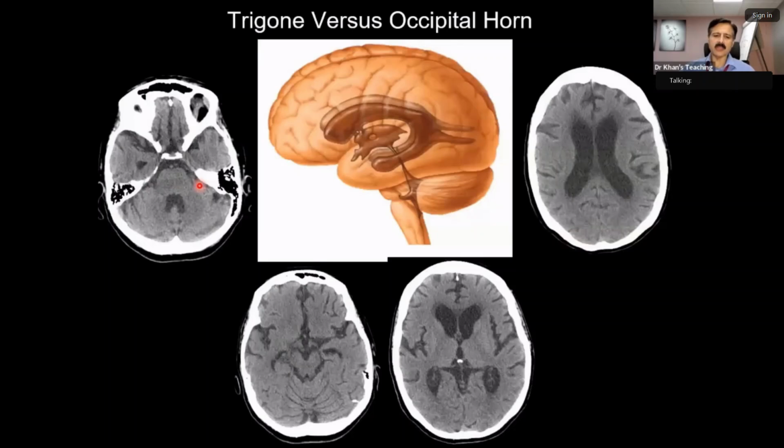You will see that when there is transtentorial herniation, one of the things which will happen is that the cerebellopontine angle cistern on the ipsilateral side will become widened as compared to the contralateral side. In the exam, there can be marks for the description, because the examiner has to discriminate between somebody who will get 6 marks and pass, and somebody who will get 6.5 or 7 or 8 marks. So descriptions are important. They are seeing what you are picking up.